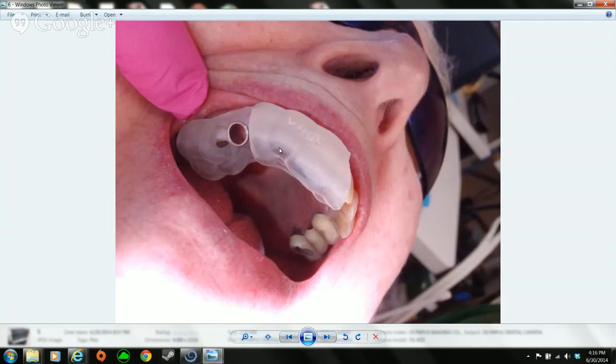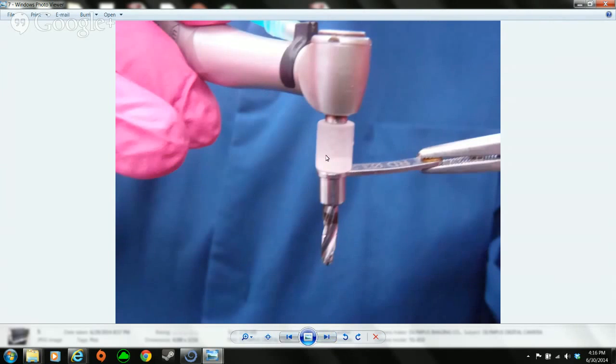It fits beautifully. This digital protocol with the intraoral scanner, everything just absolutely fits beautifully. This is the printed 3D drill stop. That's also from Blue Sky. And we're using a key, so we're using a tube within a tube. The doctor just prefers to do it this way. That way we can use maybe 2 drills on this one, but in limited space, or in softer bone, the direct cut 1 drill technique also just works beautifully.